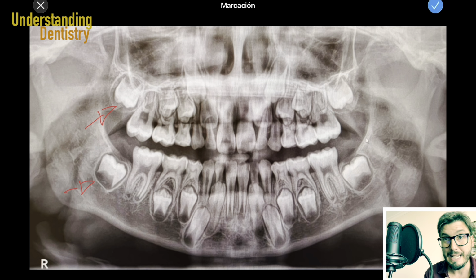All right, then take a look at this. Very clear aspect. We have the deciduous molars, and deciduous first and second molars are always on top of the first and second permanent premolars. Take a look at this. So we have the deciduous first and second molars, D or E teeth, and then we have the first and second permanent premolars below them. So very clear. Very easy to remember.